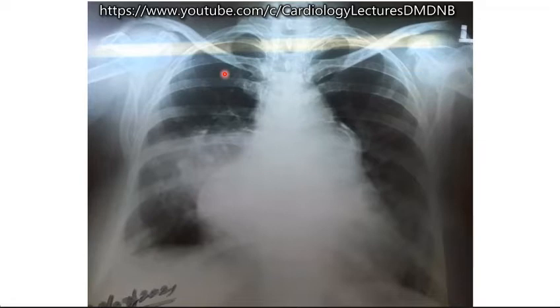No, but it is not small because usually in ASD, what will happen to the aorta? The aorta is not prominent. Usually it becomes very small because only a small quantity of blood reaches the left ventricle, and usually the aorta will be smaller in size. What is the shunt lesion in which the aorta can be prominent? VSD, sir. Not VSD. PDA, sir. PDA. In PDA, the aorta can be slightly prominent.